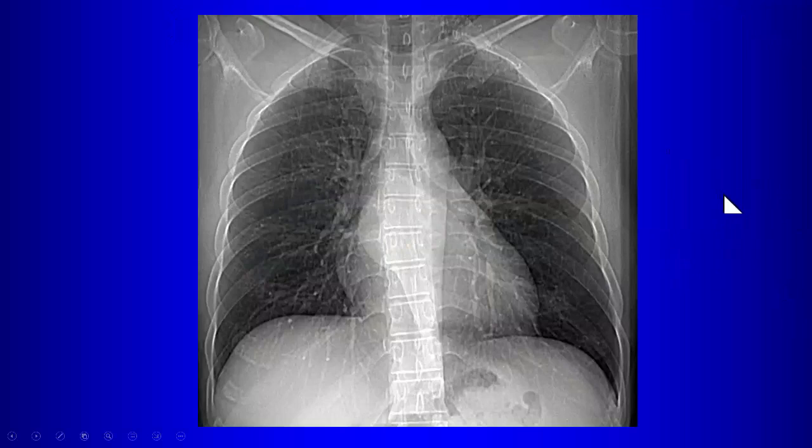Okay, so starting with this chest radiograph, what line is abnormal here? Yeah, so this line here represents the descending aorta, this line, the left paraspinal line, right. So here's the azygoesophageal line, so you can see how it's deviated here.